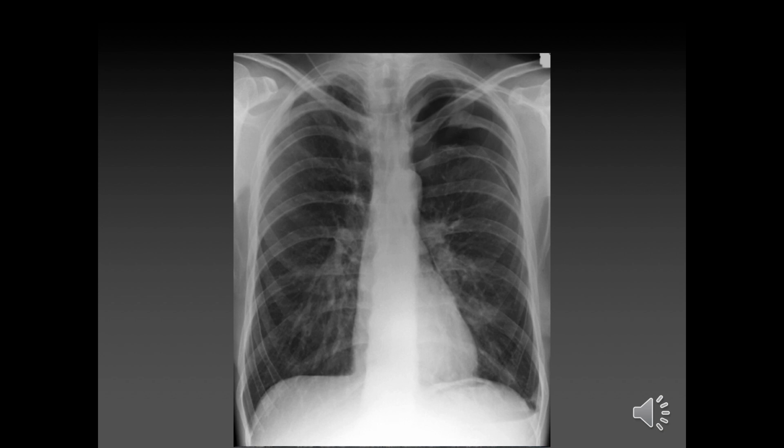So, anyone have any idea what this is? So the patient, how much is the patient inspired? Yeah, that's emphysema again. Oh no, it's not. It's pneumothorax. My bad. But it is over-inspired. So where's the pneumothorax?